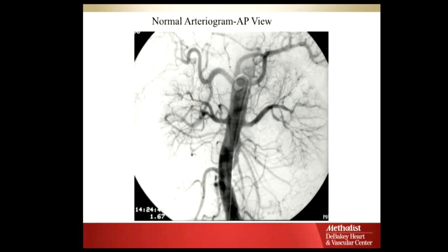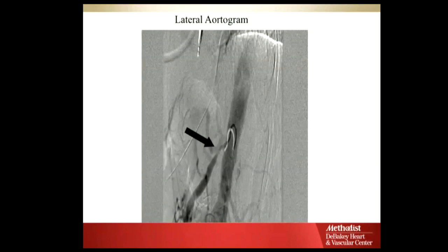And so Dr. Bashar is saying you do this angiogram to see if the patient's got an SMA stenosis. What are you going to do next? Loud and proud, as Dr. Feedman would say. Cross-table laterals, the only way you can see the origin of the celiac and the SMA. Then the patient's hands are going to be in the way. With the arms up, it's kind of a pain trying to go cross-table lateral in order to get all this information. Okay, so what am I looking at here? Okay. What kind of catheter is that?